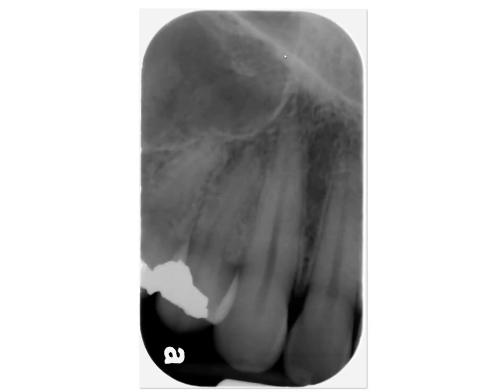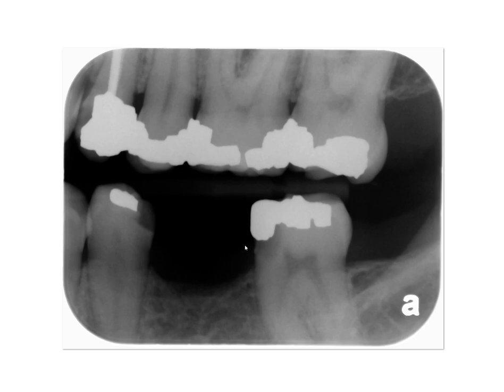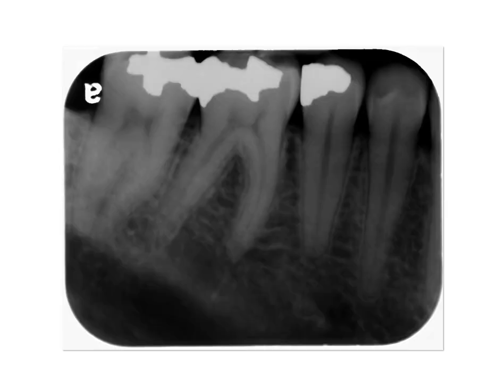Again, floor of the maxillary sinus, which crosses with the nasal aperture. External oblique ridge. Here's a great example of lingual undercut or submandibular gland fossa. It's rather radiolucent, and this radiopacity, which essentially defines the superior border of the radiolucency, represents the mylohyoid ridge or internal oblique ridge.